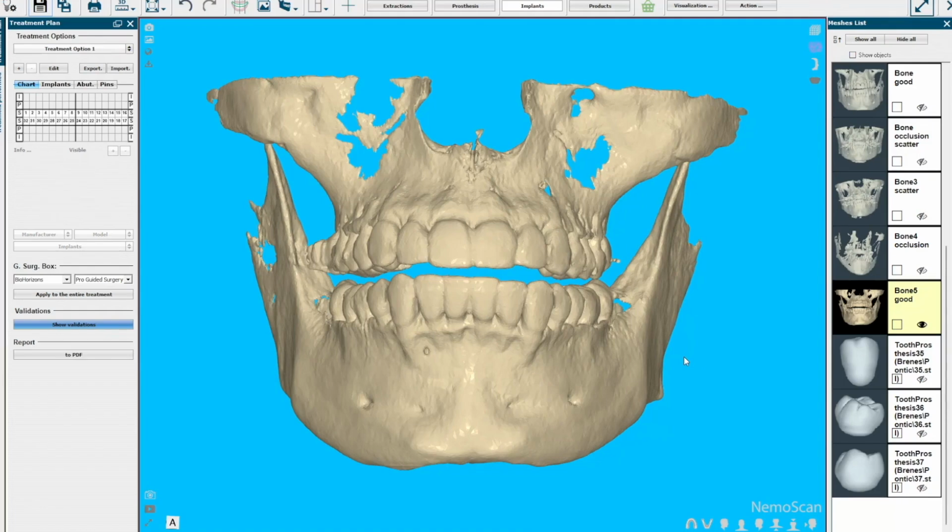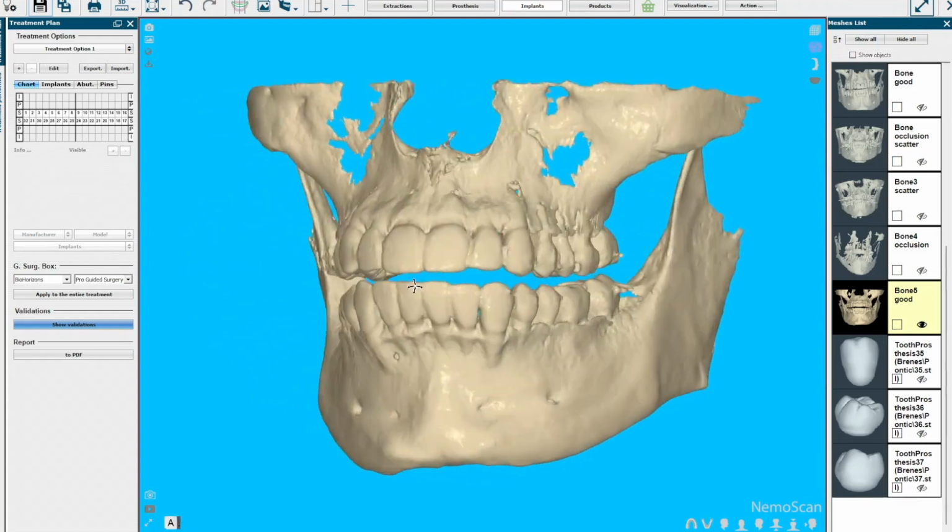Hello, my name is Michael Bradley with the New Planning Center, and in this video we're going to cover what makes a good CBCT. So this is a great example of a beautiful CBCT.